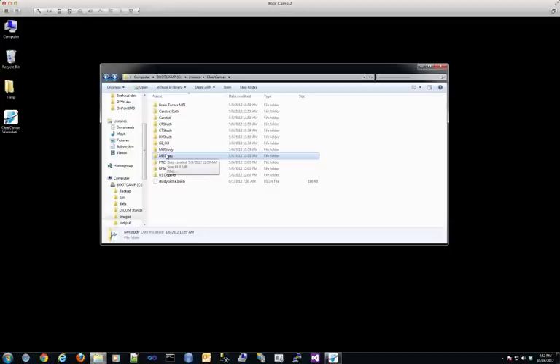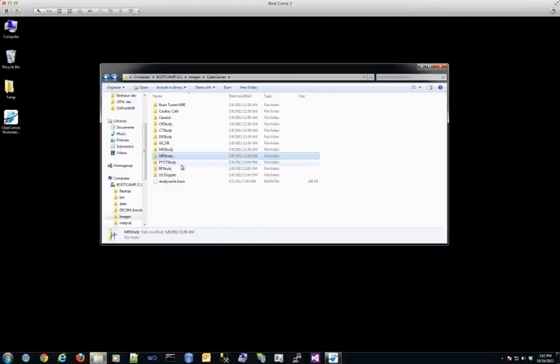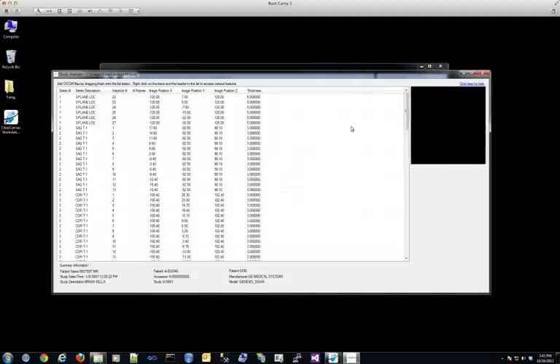Hello, this is the fourth and final video discussing advanced usage of the OnPoint Study Analyzer tool. I'm going to go ahead and open up an MRI study in the Study Analyzer tool and do some a little more in-depth analysis. So in this case, I'm going to go ahead and resize the window to be a little bit bigger. And while we have some default attributes that we show that makes it easy to sort through a study and see what's there, I'm going to do some more in-depth analysis for MRI.